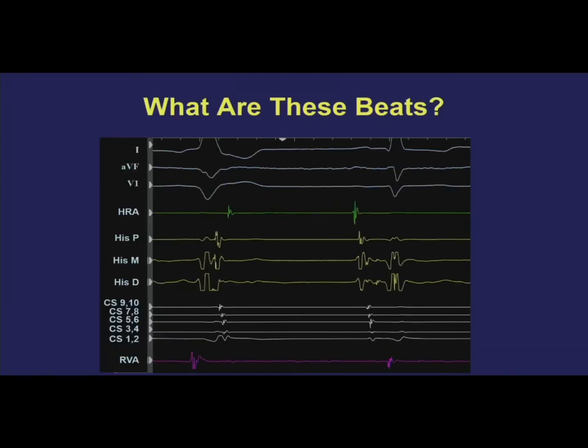Okay. Quiz time. So, there are 2 beats on this page. And now from everything we've discussed, you have to tell me what these beats represent. And you can do either beat first. This is the yell it out, don't text it to your iPad.